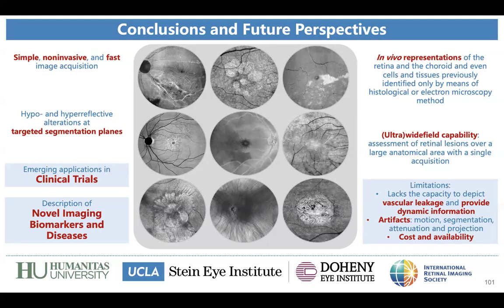The segmentation is how the device names the lines that will separate that scan.